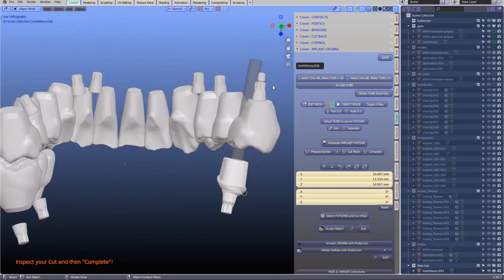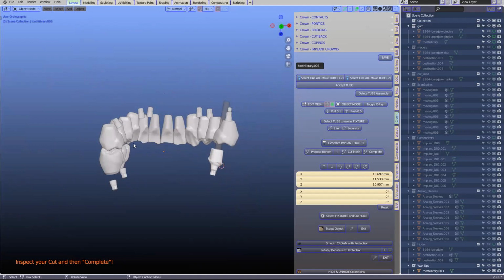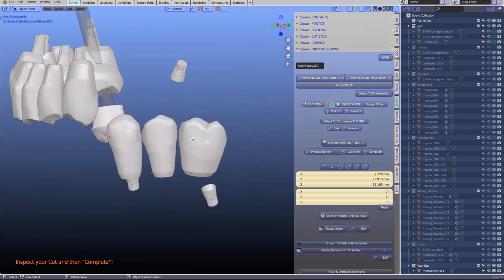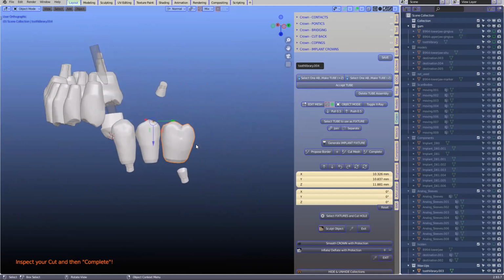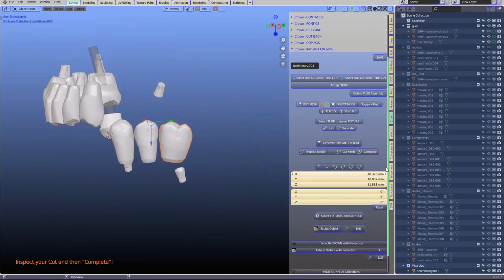This one goes then through this side, and then we've got a locator and it's selected both of them, which was a bit annoying. So yeah, these are things that we need to point out as well. Here it's a good idea to have a minimalistic approach to your 3D working window. Just hide all kinds of things and just focus on the job at hand.